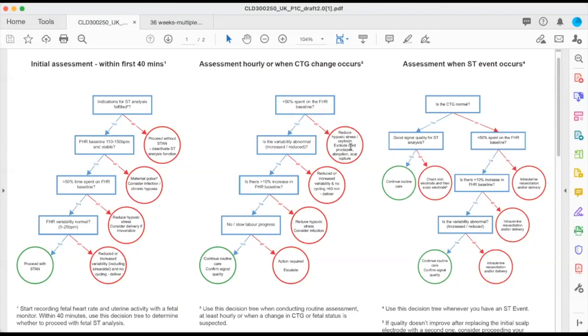The ratio, it's not just looking for a single time when the ratio is bigger. It needs to make sure that this ratio is persistently bigger for a time to start giving you an alarm. It's trying to avoid the fact that when the baby has a normal glycogenolysis, then the ratio is going to change. Does that make sense?